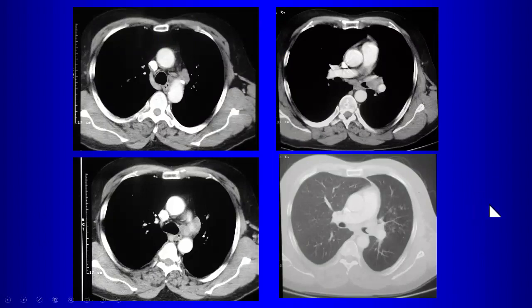What's the diagnosis? Could be that, but you can do better. The answer is on the image. Oh, there's a bronchogenic tumor here. So it's bronchogenic cancer. What cell type? Probably squamous cell. Squamous cell cancer of the left upper lobe bronchus here with metastatic nodes to the mediastinum. What are these small nodular opacities? The collapsed bronchi, like the tree-in-bud. Yeah, this is bronchiolitis from obstruction of the airway. There's some bronchiolitis there in this case.